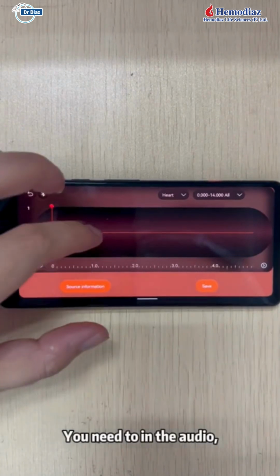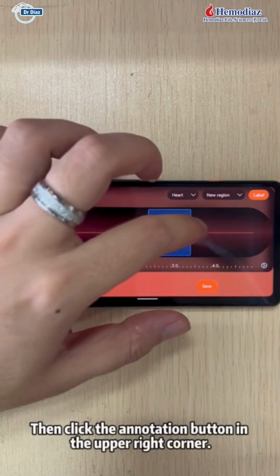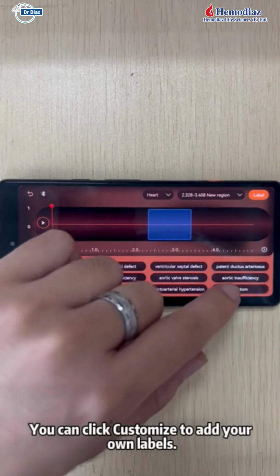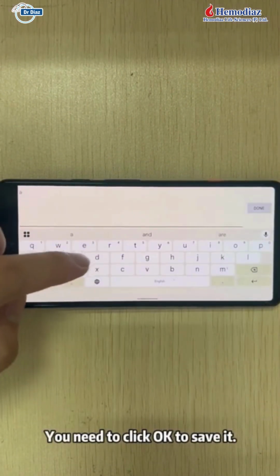You need to annotate in the audio. Use your finger to drag the pathological sound interval. Then click the annotation button in the upper right corner. Select and click the corresponding label in the label list. If there is no desired label, you can click Customize to add your own labels. After marking, you need to click OK to save it.